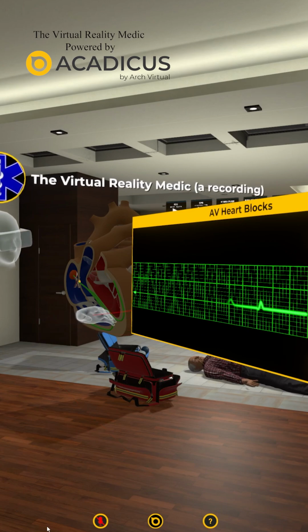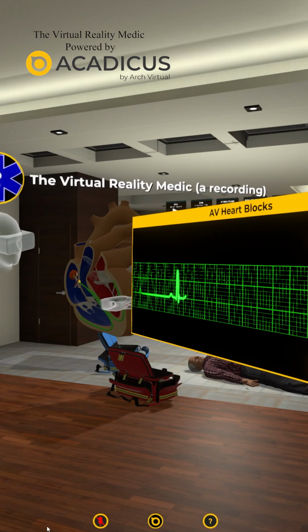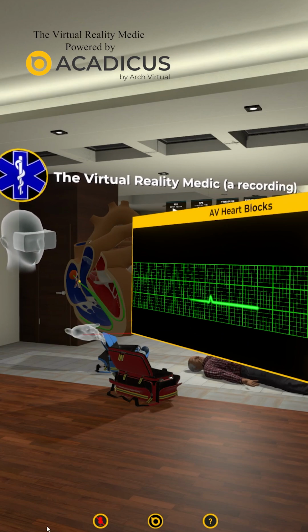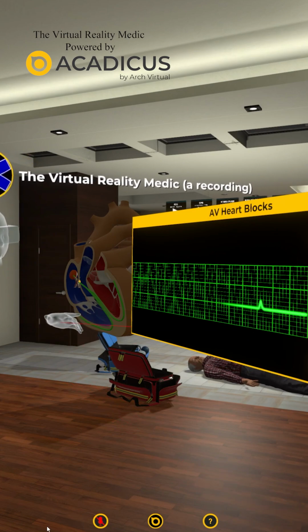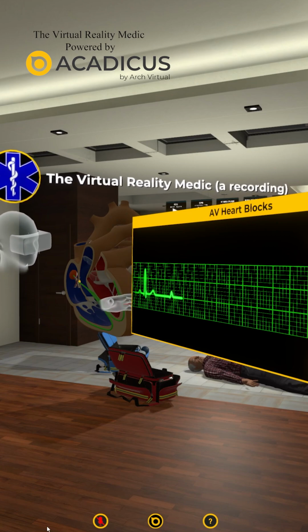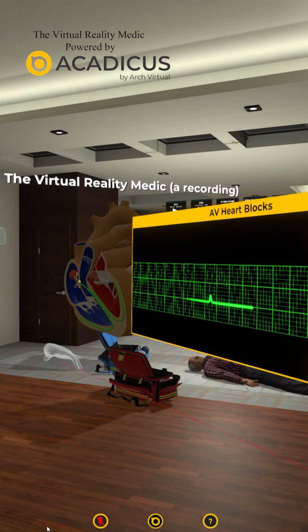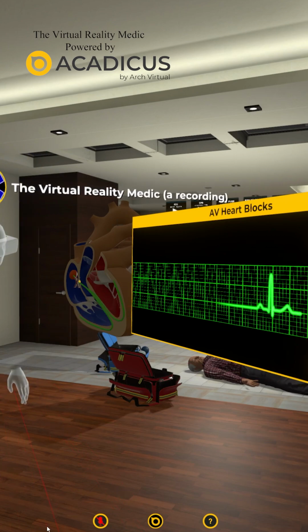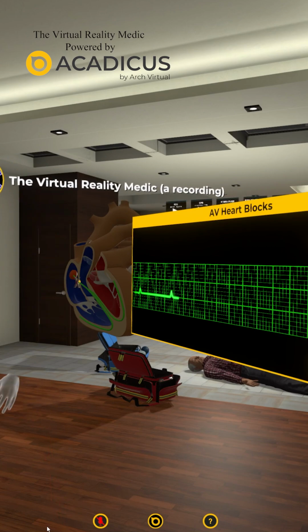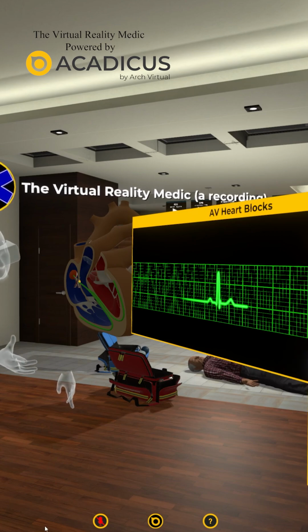So what do you get on your ECG? You get a P wave. Whoa, no QRS complex. Then you get a P wave and a QRS complex, and they're within that same big box, which is good, 0.20. That's what we want. Oh, look, there's a fire, nice QRS. But look, there's no QRS complex there. No QRS complex there. That means that sometimes there's a full block at the AV node. That's not good. That's getting worse. Because it could turn into something like this.